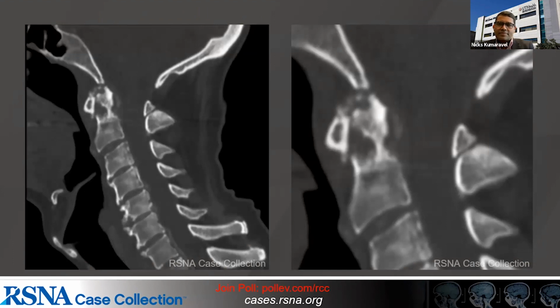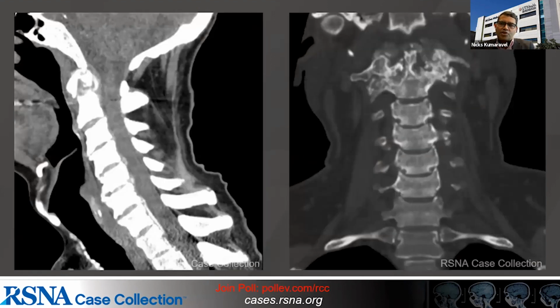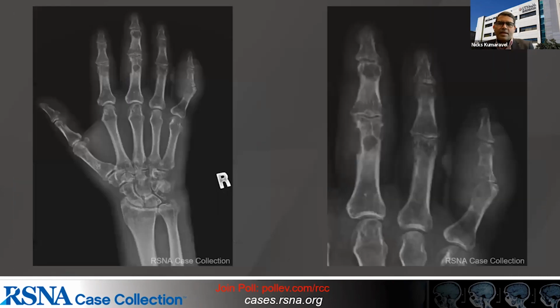And the next slide, please. We've got a soft tissue window and a coronal multiplanar reformatted image as well, just to highlight the features that could be potentially causing pain in this patient. Go to the next one again, please. And we also found that the patient had other things going on, and here is in the patient jacket.